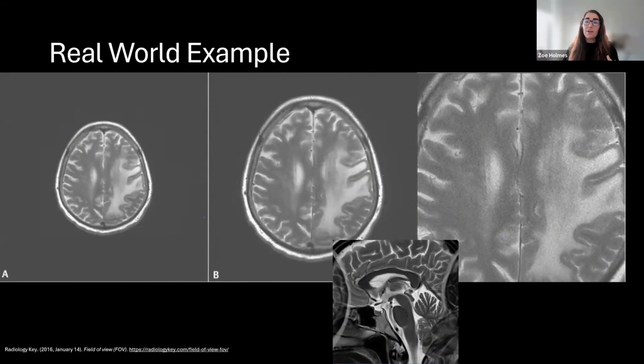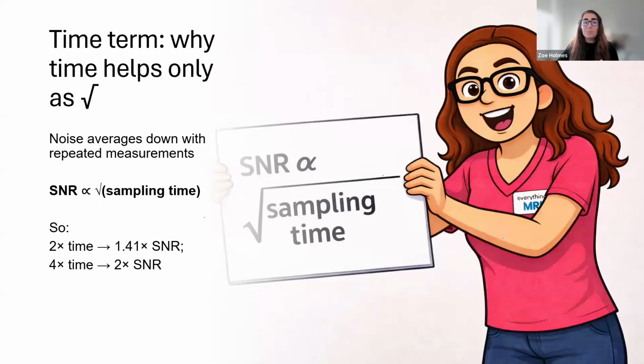This is the consequence of having a really small field of view that's within the anatomy still, but not accounting for anything else and keeping our protocol without oversampling. If we are aiming for a really small field of view and the anatomy is within that box, we need to think of other ways to reduce that wrap artifact and aliasing, maybe oversampling. Or if the clinical question doesn't need that really small field of view, we can consider a larger one as well.